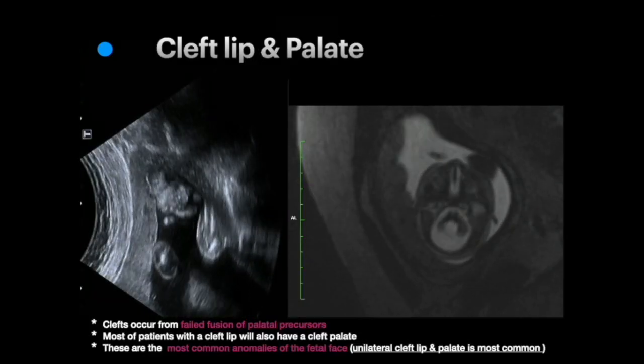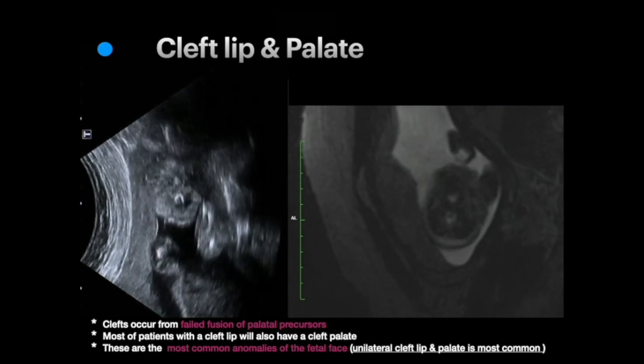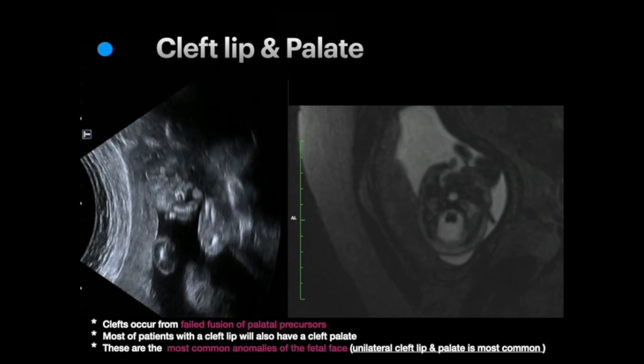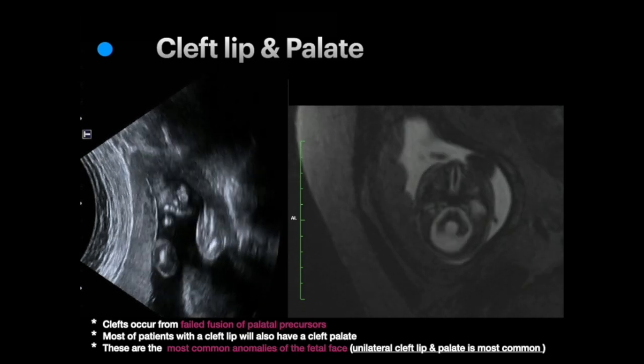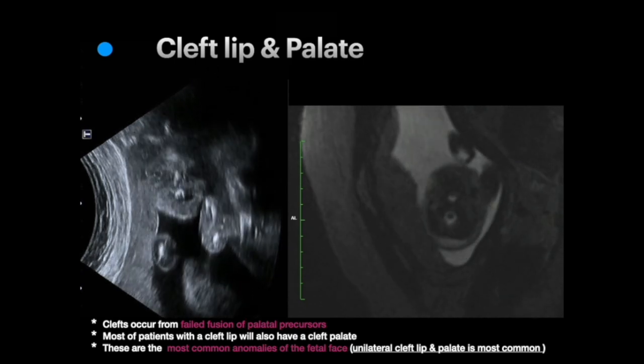The facial clefts can usually be depicted with ultrasound. However, the extent of the clefts and associated anomalies may be better evaluated with MR imaging. Whenever you need detailed anatomic resolution, you may also acquire 3D volumetric sequences such as SPACE.